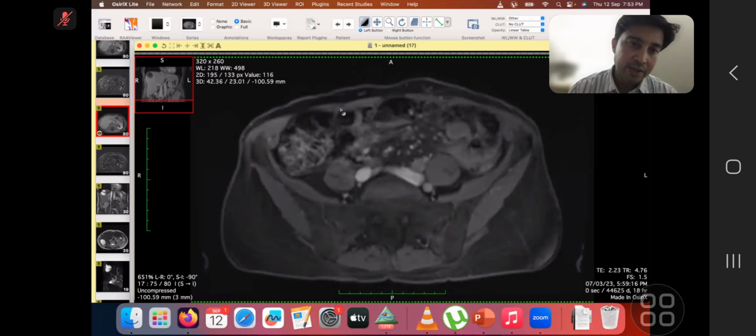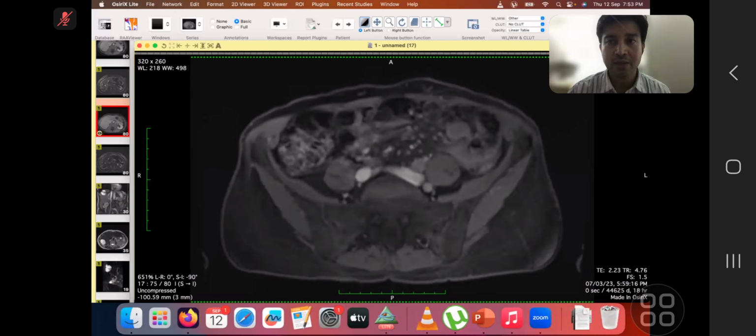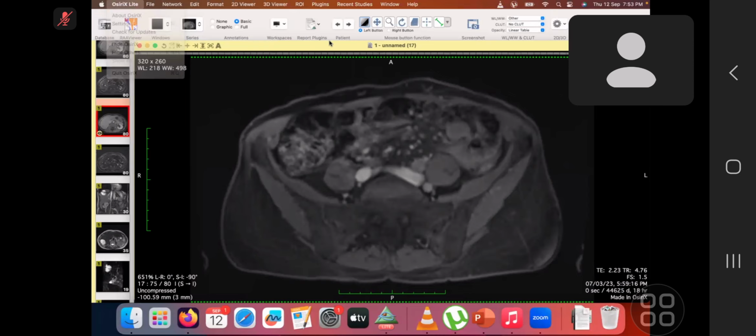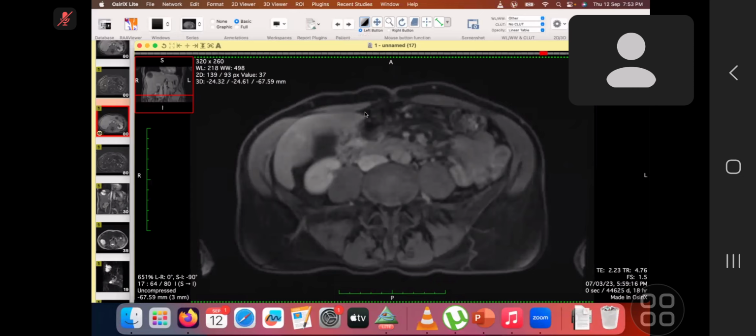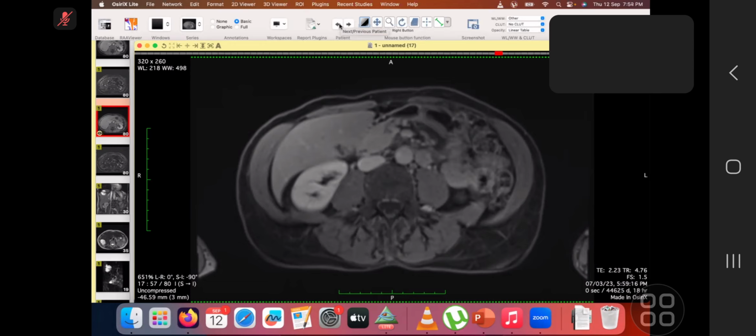Okay, we also have a CT in this patient. Let me show you. What is your diagnosis for the liver lesion you mentioned? This is the gallbladder. So this could be a hydatid cyst in the liver with two lesions, if the left lobe lesion has a similar appearance on T2. I think I overlooked this lesion. So this could be a hydatid cyst, and the vertebral lesion needs further imaging or confirmation.